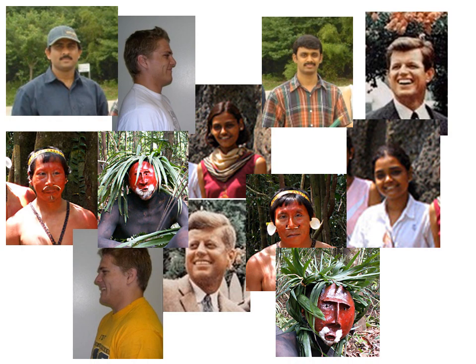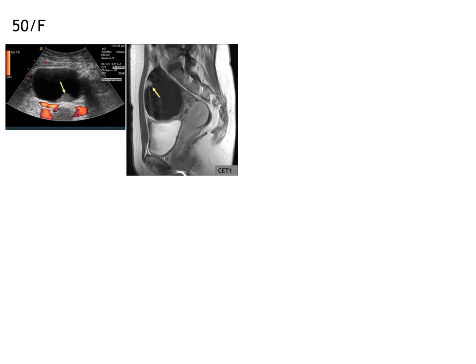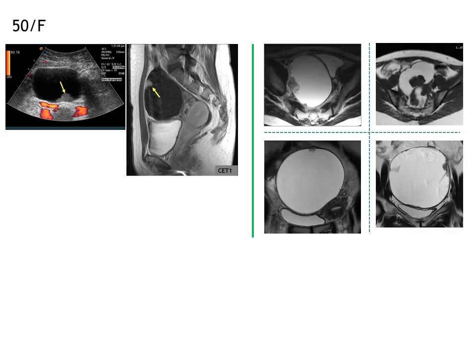I think this is something like this kind of matching process of similar patterns of faces of brothers or sisters. Let me show you an example. Here is a 50-year-old woman with an ovarian mass, unilocular cystic with a mural nodule. And here are 4 more different cases with a similar pattern. Maybe we can draw this pattern like this schema.